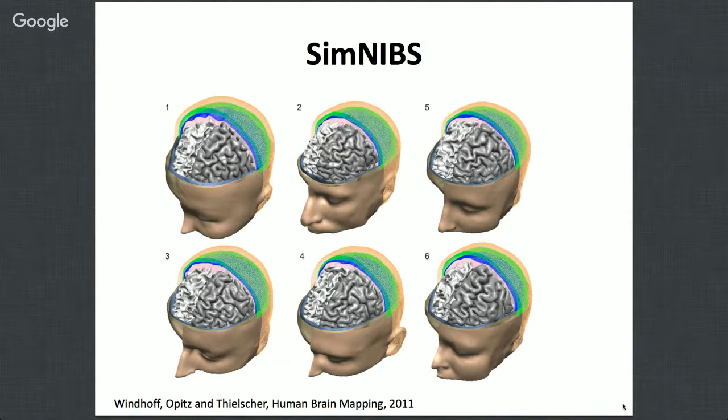We have a free open source software, SimNIBS, which was started nearly 5 years ago, and which I'm now going to demo a little bit.